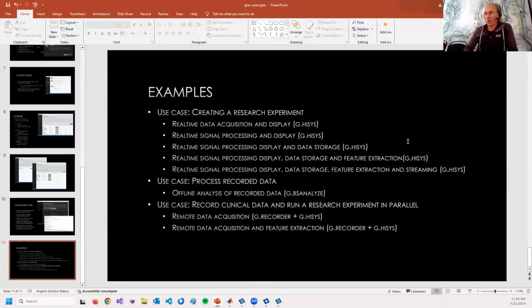And somebody's asking, how can you combine a virtual reality device from Meta with EEG data from g.tec? From g.tec, at the moment you'd need a PC in the system, and you can stream data with some network interface like UDP, TCP, or Lab Streaming Layer.